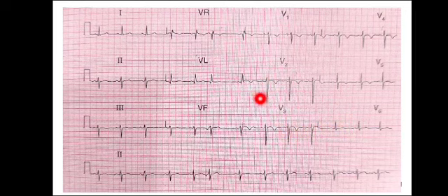So if we say, this is basically sinus rhythm with left axis deviation, along with that we have T wave inversion with a small Q wave in AVL. If I ask you a question, what would you do if a patient presents with chest pain for about 1 hour, and you see this ECG? Basically this is an anterior, acute, non-STEMI.